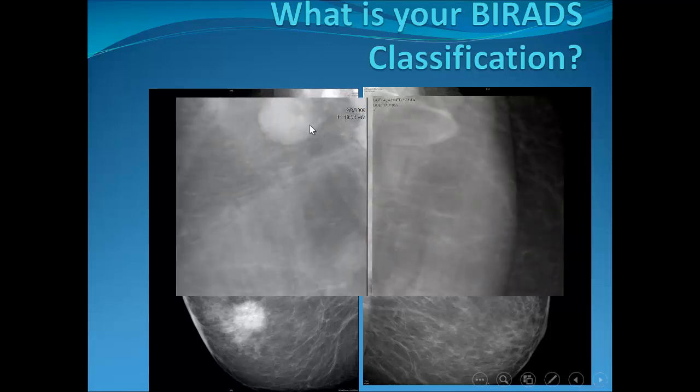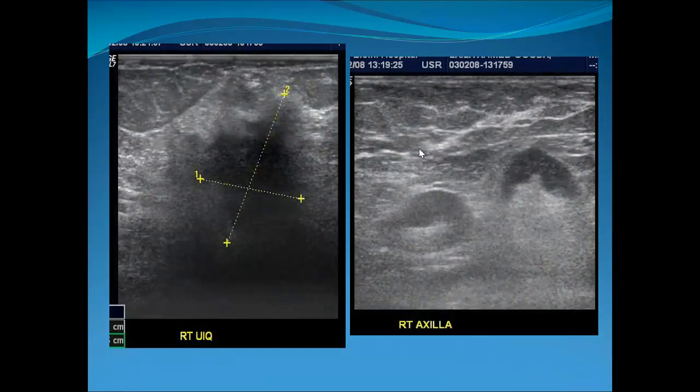You can see here the difference between the benign axillary node and the malignant axillary node. It is more globular, eccentric hilum, and more dense. But here the hilum is preserved and the cortex is thinned out. And this is another case with ultrasound. And this is thick eccentric cortex of the lymph node.